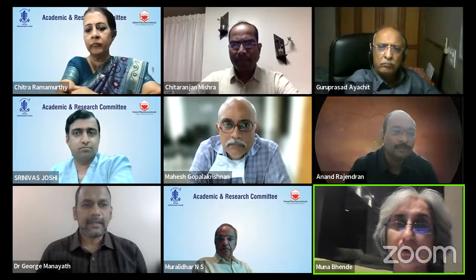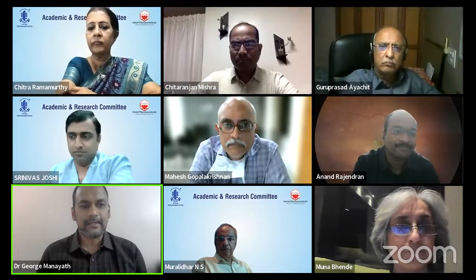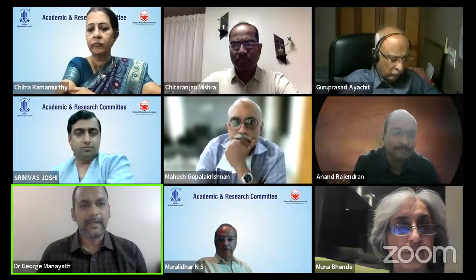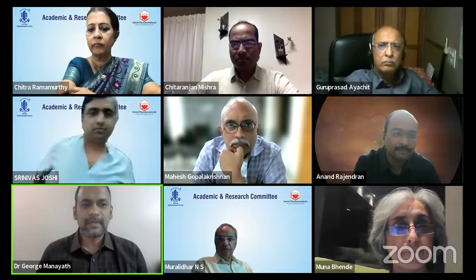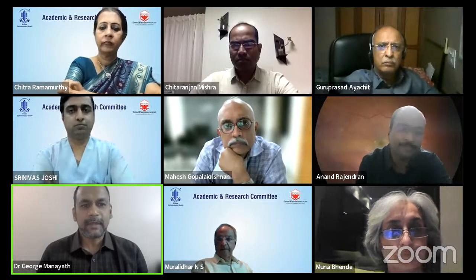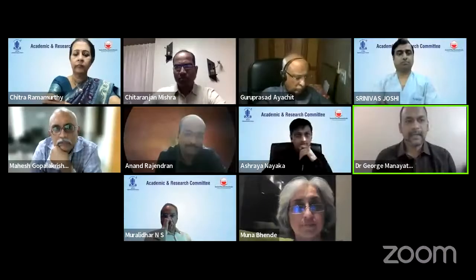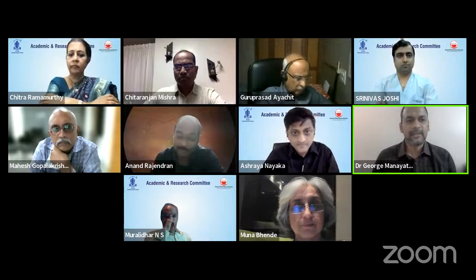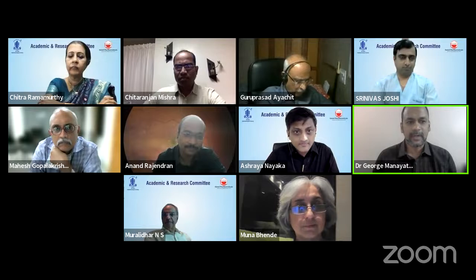This was a very nice talk. Thank you, Dr. Mahesh, for a nice talk and covering ICG. I just want to add that you already brought in the point of ICG mimickers of PCV also, because we talk about the first 1 minute appearance of the hypercyanescent nodule with a halo of hypocyanescence, along with BVN, that is classic, and the first 6 minutes of ICG angiography as a diagnostic sign for polypoidal lesion on ICG.